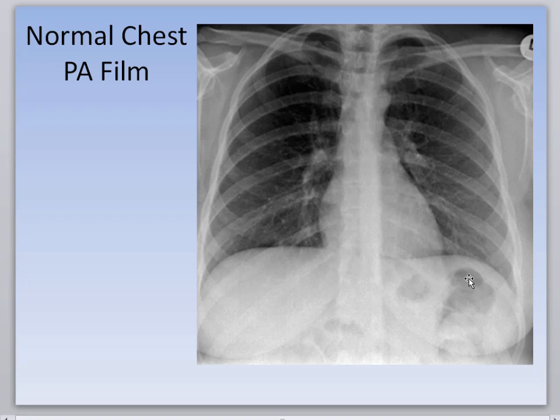This is the Magenblase, or gastric air bubble, which is air in what part of the stomach? The fundus. It's actually superimposed with a little. This patient has a lot of gas in the splenic flexure. We'll see a better one in a minute.